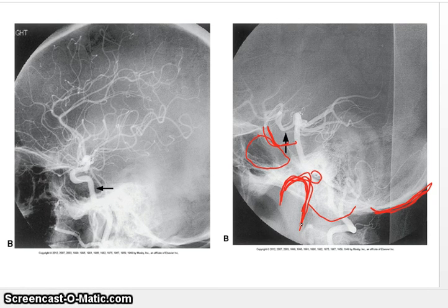Let's see, on the picture on the left, the carotid siphon is superimposed right over that sphenoid sinus. So here's the sphenoid sinus, I'm circling, and then right above the sphenoid sinus is the sella turcica, in which the pituitary gland sits. On this picture on the left, I don't see the EAM very clearly, but let's just say it's right here. It's going to be in the center of this big white chunk, which is the petrous portion of the temporal bone. And again, here you've got the occipital bone, here you have frontal bone, here you have parietal bones.